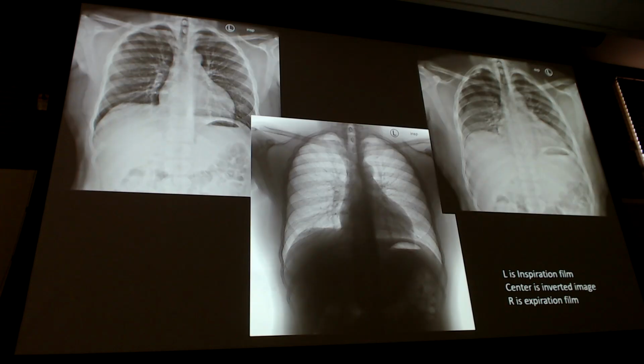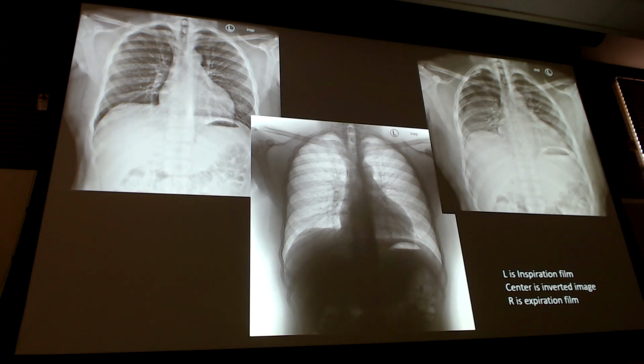Does that center one have any? The center one? No. Right? Because if I'm looking at mediastinal structures, my trachea is where it's supposed to be. This is my right atrium, right? The heart pops a little bit more when you invert it, but this doesn't look like it's shifted one way or the other from a mediastinal standpoint. And even if it was, this patient has a pneumothorax on the right side, so we would need pushing over to the left, right? Because it pushes it over.